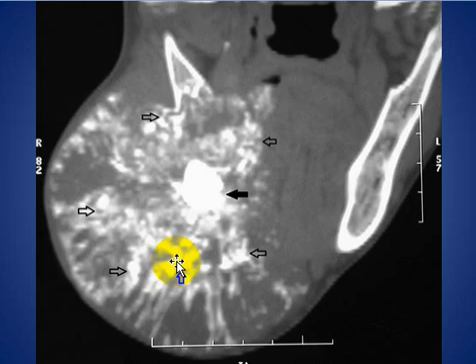Here, this is the CT scan of this patient with a well-defined heterogeneous tumor involving the right side of the mandible with multiple irregular calcifications giving the appearance of a snowflake sign, as we see here.